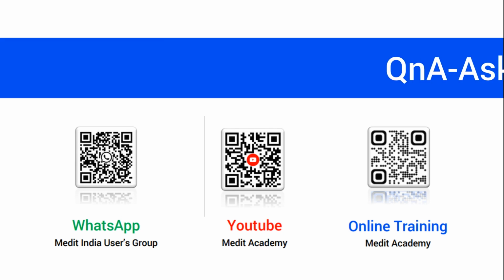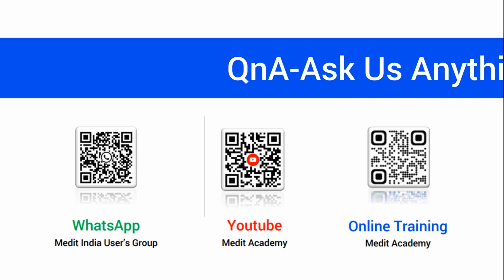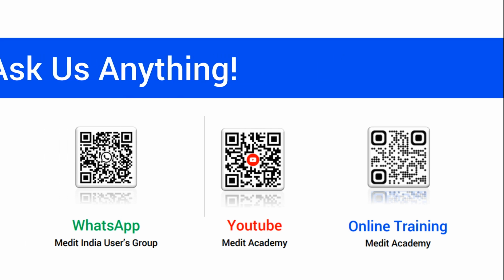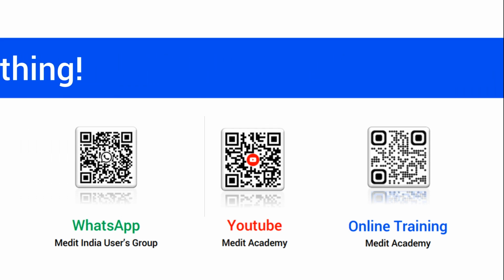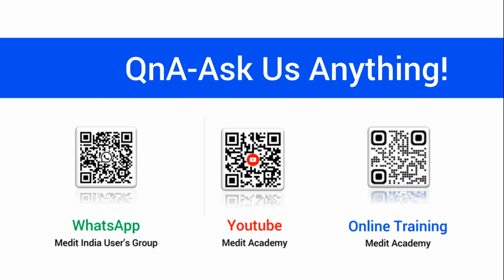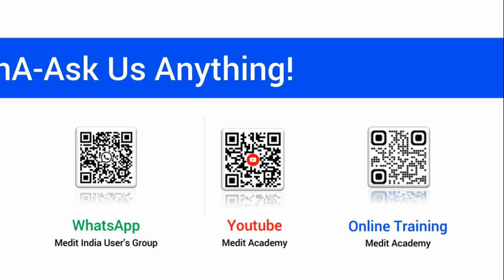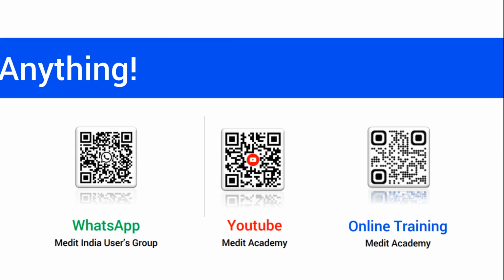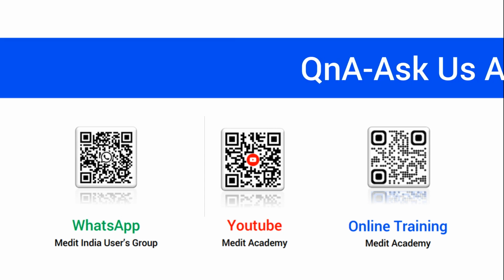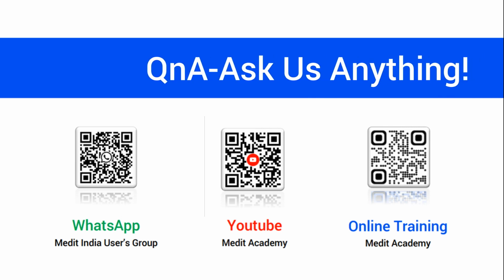Another question I have here today is how should I do a proper scan? What is the scan technique? This may not be in the scope of this webinar, but just to help you out, on the top left-hand side of the scan page, there is a question mark. That would have, if I'm not wrong, about 12 to 15 videos, 4 of which would tell you exactly what the scan strategy is that Medit follows for a full arch, half arch, and for occlusion. Alternatively, the Medit Academy YouTube channel also has a video on the perfect scan strategy.